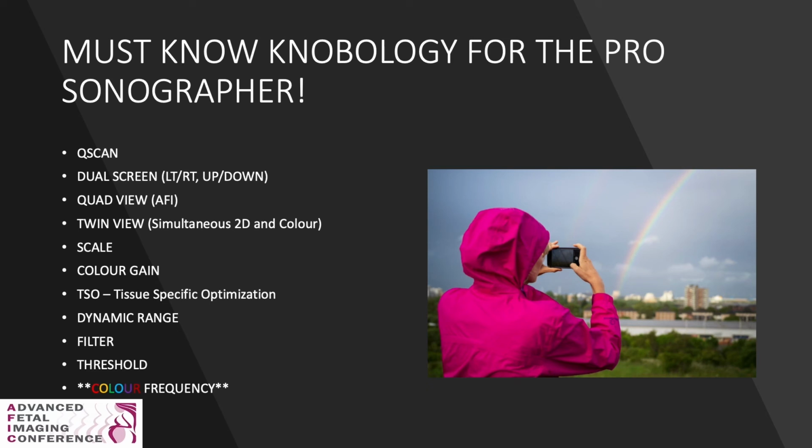Qscan, dual screen, including left, right, and up-down layout function, quad view for AFI, twin view, producing simultaneous 2D and color, scale, color gain, TSO or tissue-specific optimization, dynamic range, filter under pulsed wave, threshold under pulsed wave, and the most important and one of my all-time new favorites, color frequency.